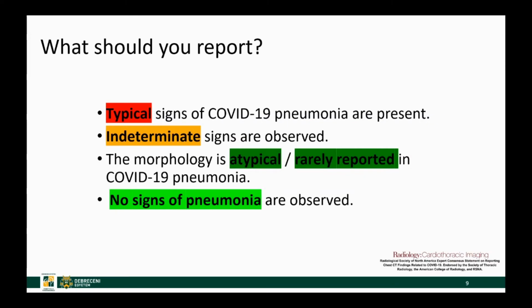Speaking of which, here are the things that you should report. You should report if you see typical, indeterminate, or atypical CT findings of COVID-19 pneumonia, and you should definitely report if there are no signs of pneumonia at all.